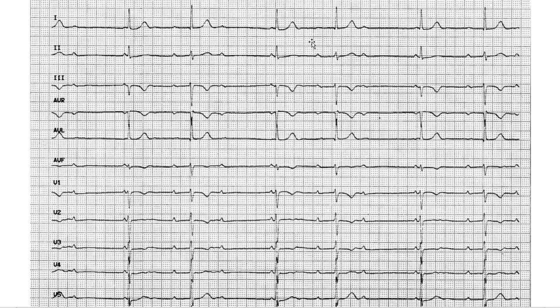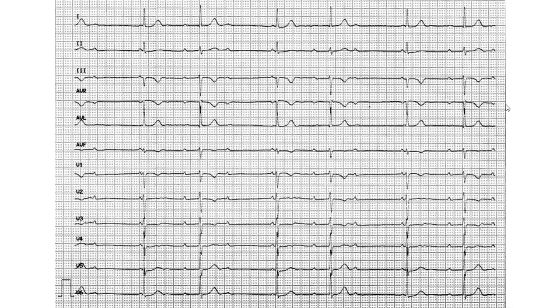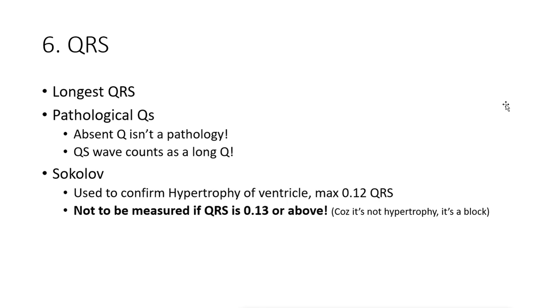Mainly, I'd say that it's not enough evidence, because it's irregular, yes, but you can see P waves, okay? So I wouldn't say fibrillation, okay? That is the main thing that I would say, and that should clear things up. That's the main point I wanted.